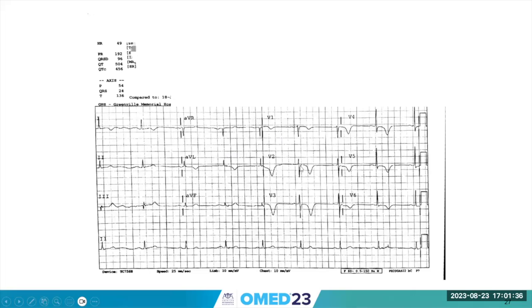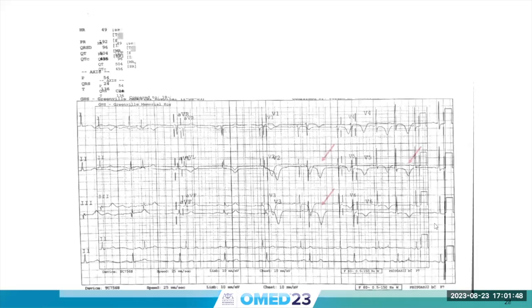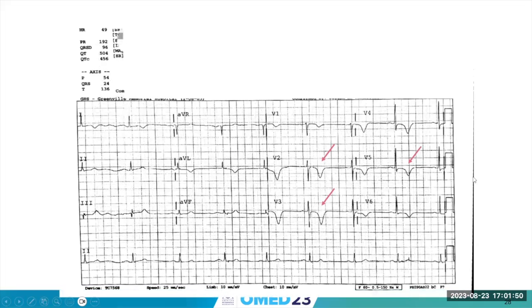However, if I told you this is a 50-year-old male with a history of exertional angina, but he's not presenting with any pain at this time, okay? So you're doing this EKG as a screening, et cetera, and it's coming up to look like this, and he is not having any discomfort whatsoever. And then again, we have the positive arrow sign on the EKG, right? Showing us that yes, we are in fact to be clued into these deep T-wave inversions in the precordial leads here.